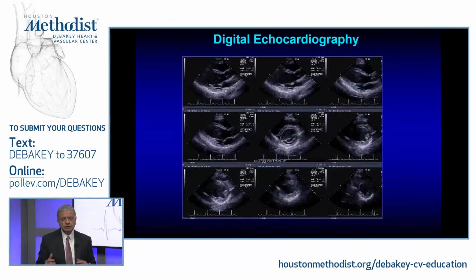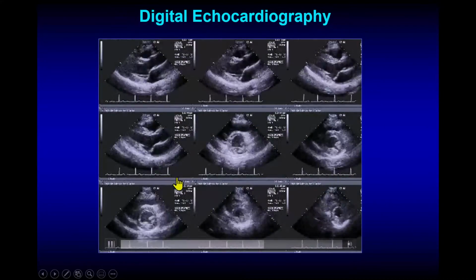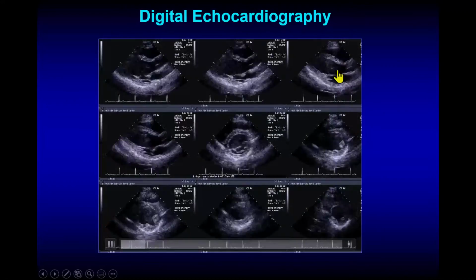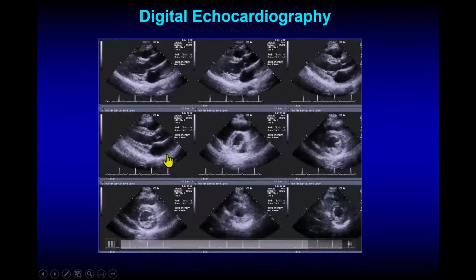Take the digital echocardiography and different displays of this heart for you to decide which ones to measure, which ones to quantitate. Let's take a look at here, for example, the LV outflow tract. This is not probably the one I would use. It gives me a choice of where I could use. You could zoom on it, et cetera, et cetera.